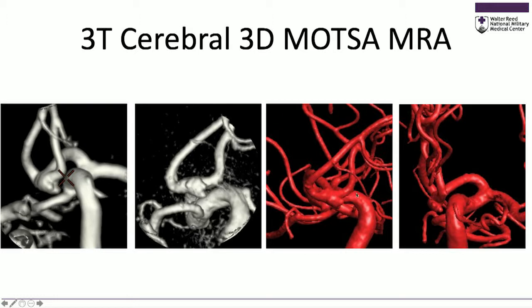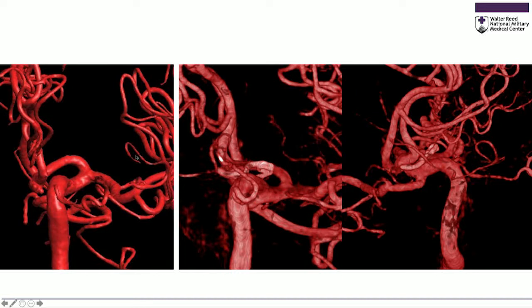In fact, the angiographer who did this, our senior neurosurgeon, was bemoaning that he thought our pictures looked a little bit better. But this tells us that this aneurysm has bled multiple times in the past, although she didn't have any symptoms. So armed with that information, the decision was made to treat the aneurysm, and they decided to go ahead and do neurosurgical clipping.